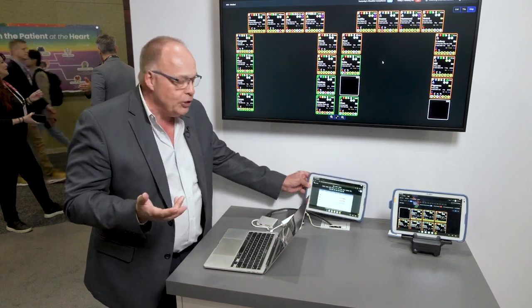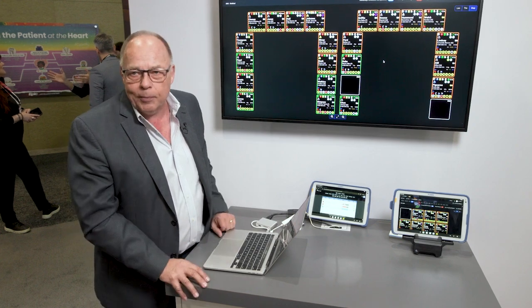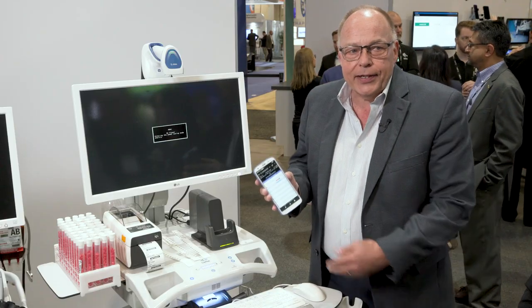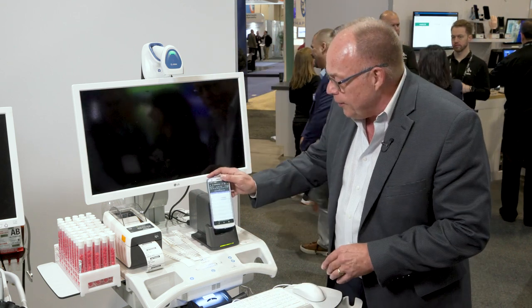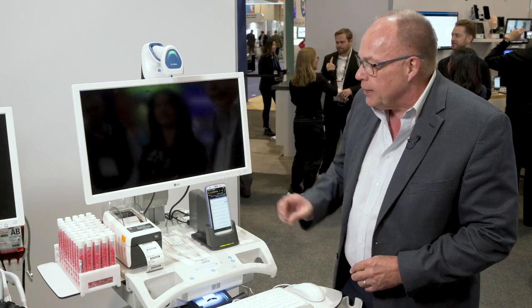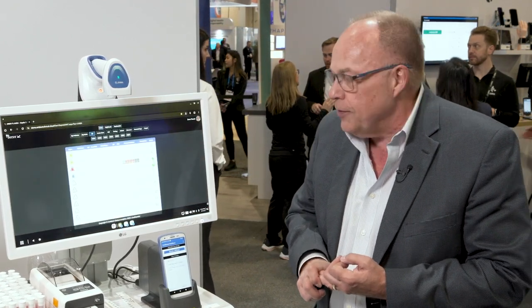So say you're a clinician and you get a notification and you need to see more information. If you have your Zebra handheld device and you get a notification for potential sepsis, you can see the information here, but if you want to dig deeper into the details, it's very easy to link to see what's been happening for this entire patient condition. The DART tool itself looks at potential sepsis conditions and also monitors the process of care delivery for that.